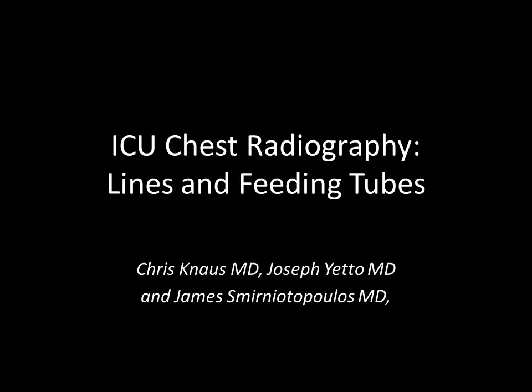This is a brief presentation on interpreting ICU chest radiographs, specifically looking at lines. This follows our lecture on endotracheal tubes.